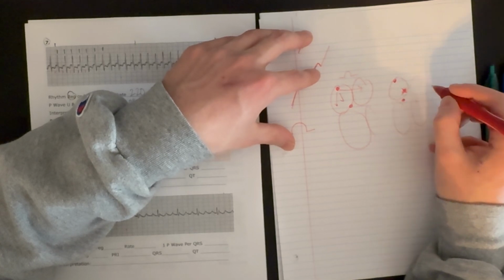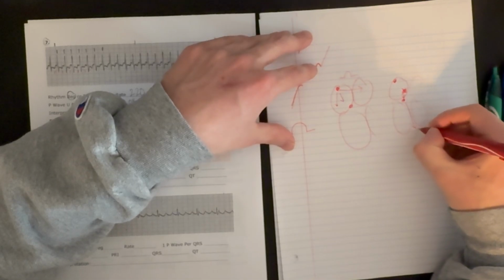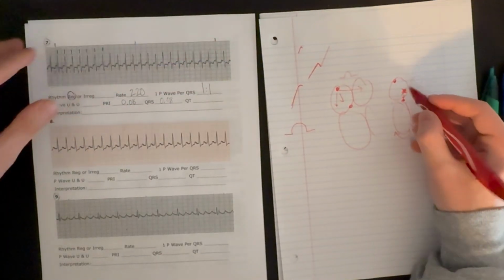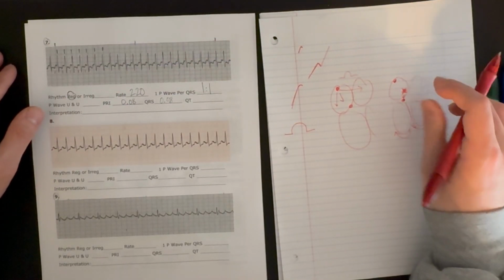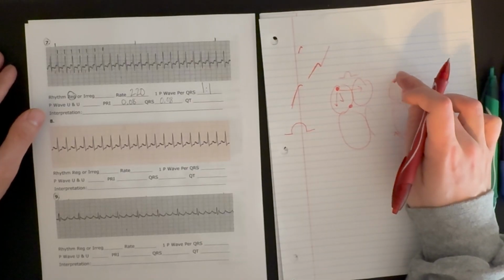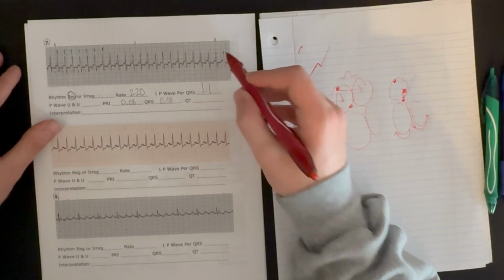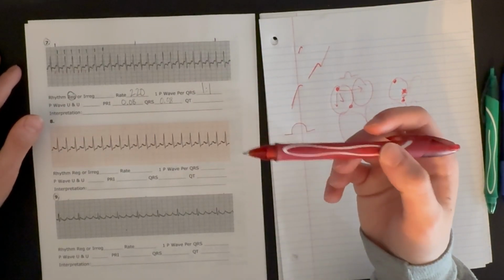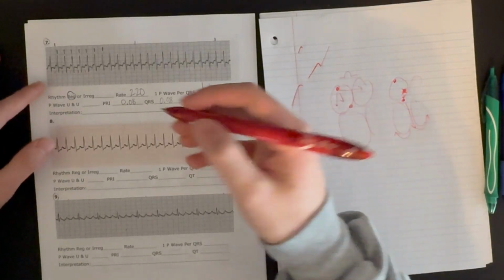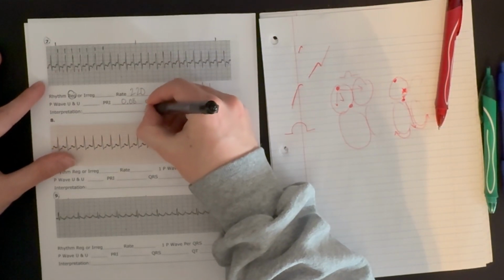And the impulses that it's sending out are causing depolarization of the atria before the SA node can do anything. Now it's still getting to the AV node down the normal conductive pathways and depolarizing the ventricles. But because it's not coming from the SA node and it's not depolarizing the atria in the normal order of top, left to bottom, it's creating this abnormally shaped P wave. So what we have here is a type of SVT, specifically called atrial tachycardia. So this is atrial tachycardia.